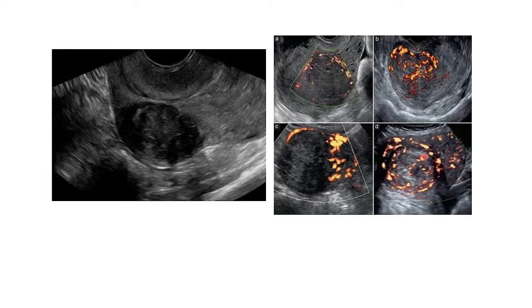So when you see vascularity or blood supply, you must query cancerous transformation. Do not just ignore that and comment it as a normal fibroid, because the gynecologist can just try to take it out when it's a cancer. So the management of cancer is very different from these benign lesions.